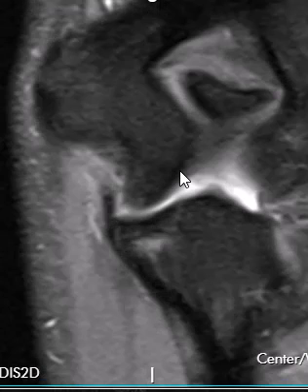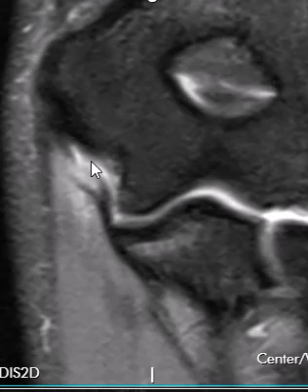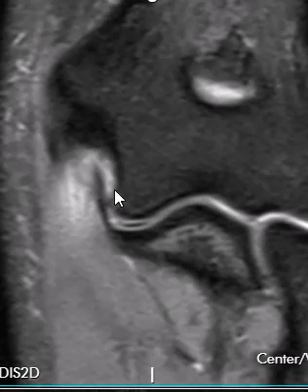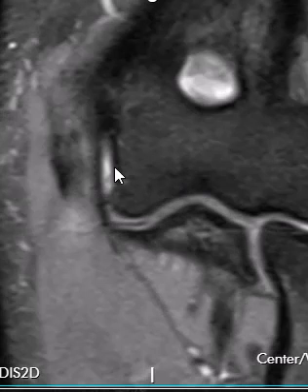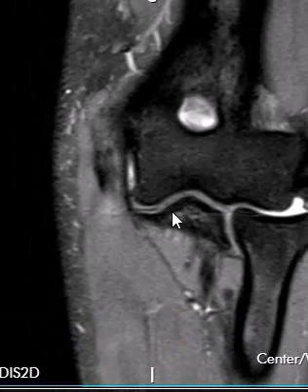Now if we go forward, if I can get the forward direction right, no, that's backwards. When it comes forwards, so again this is the posterior band. Forwards, we start to see the anterior band, and then right here we see the anterior band coming vertically. I'll zoom that back a little bit.